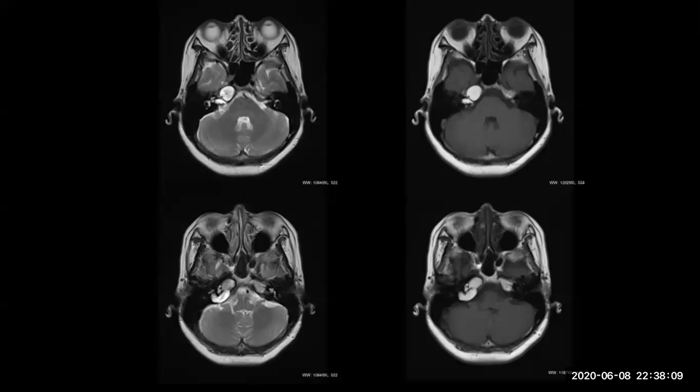Doctor, can we put hemorrhagic cystic adenoma? This cholesterol granuloma can bleed, but it is a microbleed. And during examination, the ENT doctor can see hemorrhage in the tympanic cavity. Okay? It is a cyst, by the way. This is a cyst, but with microbleed in this cyst.